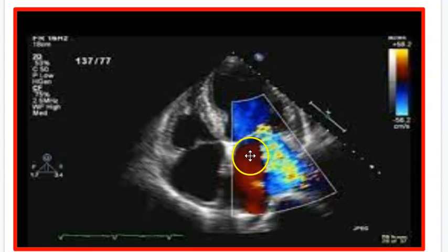So the eyeball method, although heavily relied upon, you got to remember, if this blood's coming through, regurgitating back, hits blood that's already in there, it's going to mix in with that. So it can be a little bit confusing, if you will, if this is the true jet or not. But that's why we do our quantification methods.